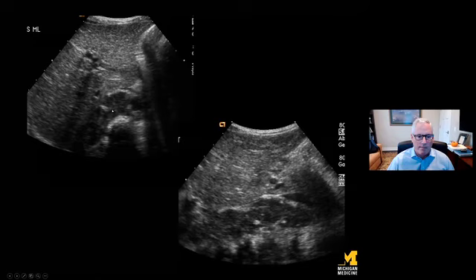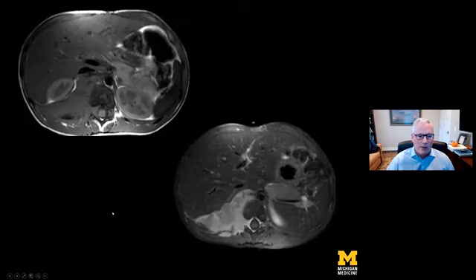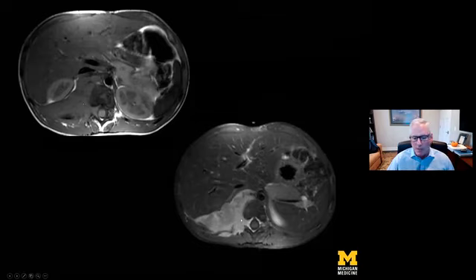Here's the spine, left lobe liver, right lobe liver, and this is all retrocrural tumor. This is actually all retrocrural tumor with some calcification extending up into the posterior mediastinum. Now we look at it at MRI, and we can see how the crus is elevated, so we understand why that paraspinal line is abnormal, and we clearly see tumor extending into the neural foramen and into the spinal canal.